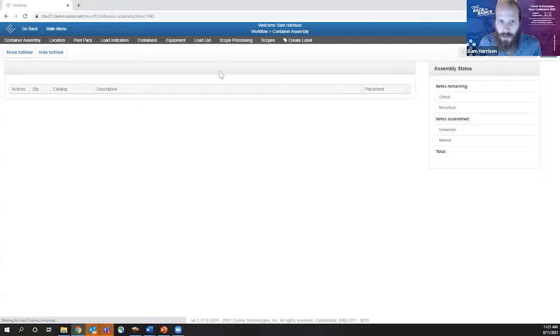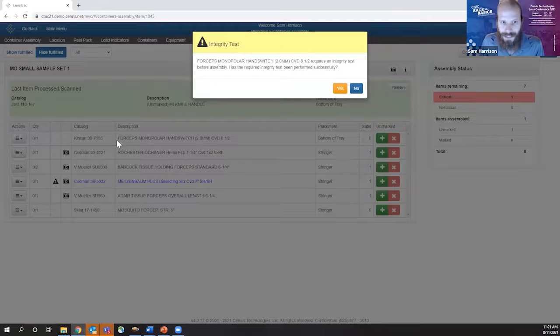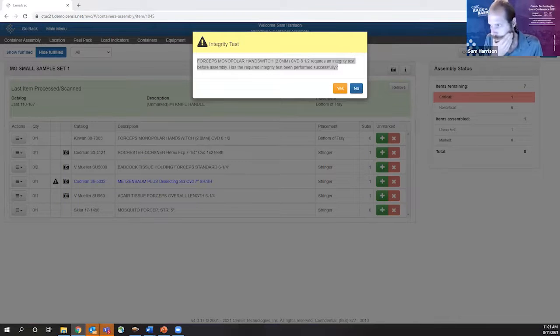Let's see, right here. You can make it prompt the user that this individual instrument requires an integrity test, and then you can free text what's required. So Anna, I think that's what you were talking about. And I hope I answered your question.